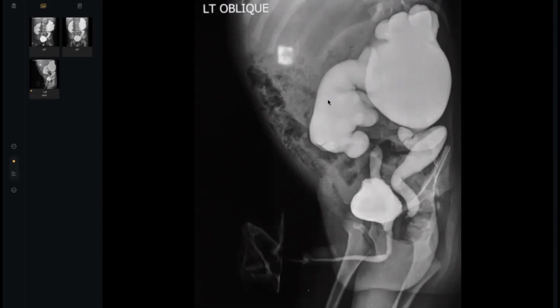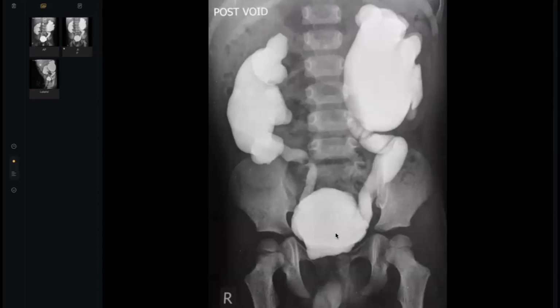Yes, it will cause this marked, very severe bilateral reflux without affecting the bladder, without over distension and trabeculation and many multiple diverticula. Frankly, it is too difficult, it is not possible. Second, the bladder here looks normal. Maybe there is one diverticulum or two maximum.